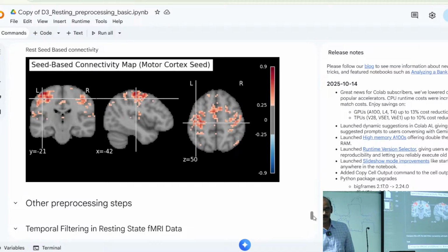Joshua, you have results? Yeah. How about others? Point 0.3, 0.2. Okay, all right. Okay, yours is also 0.25. Okay, yeah, play with the threshold, or else change the coordinate also and see what happens. Oh, and you can see that. Very good.